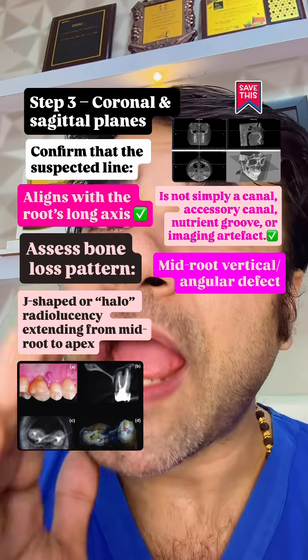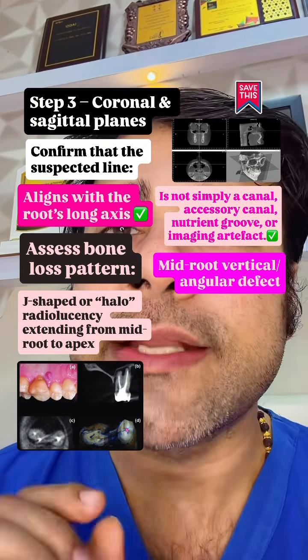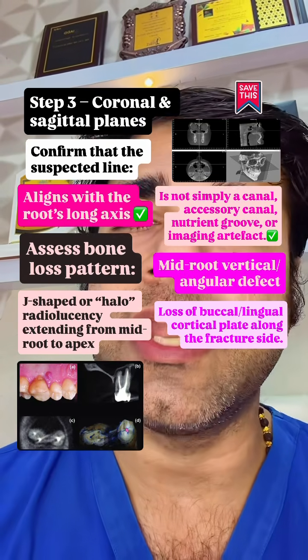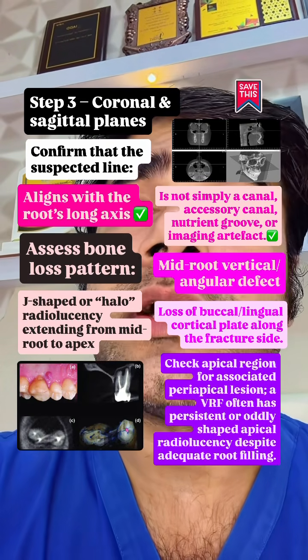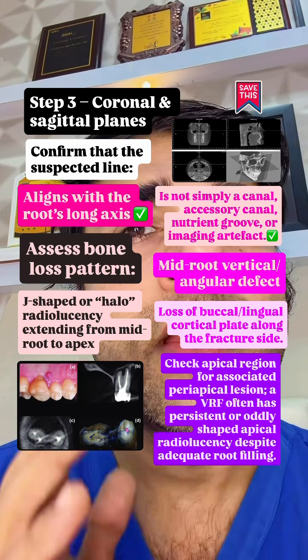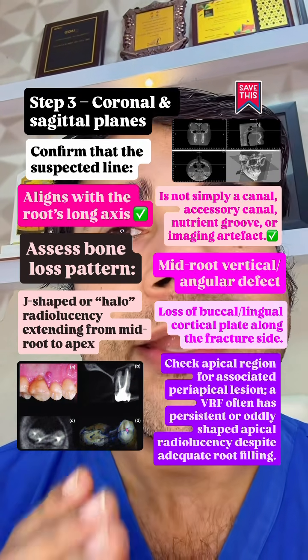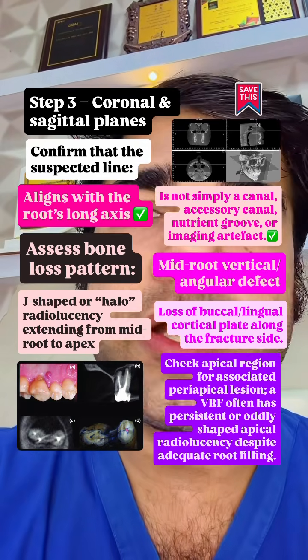Mid-root vertical or angular defect with relatively intact coronal bone. Loss of buccal lingual cortical plate along the fracture line. Check the apical region for associated periapical lesion. A vertical root fracture often has persistent or oddly shaped apical radiolucency despite adequate root filling.